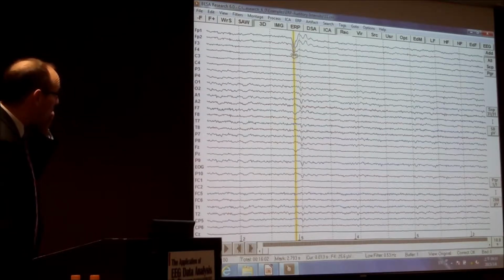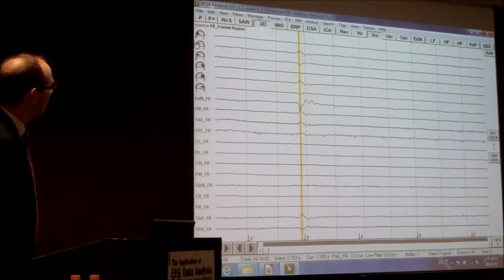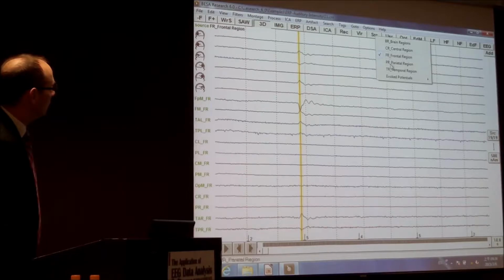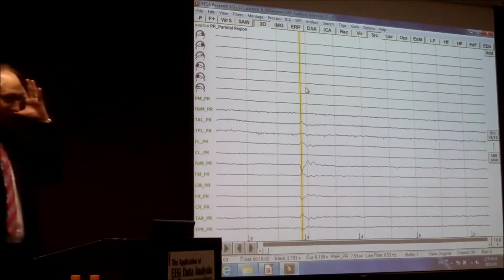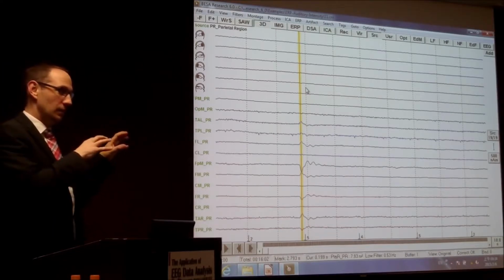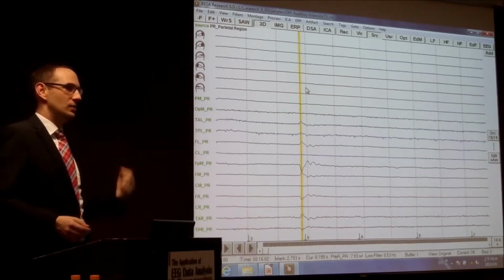And if you look now at the brain region montage, at the source montage, and look at the brain regions, let's take a frontal region, and you see that the blink is perfectly in the frontal region. See here, here, a little part here, and as well here. But if you go to the parietal region, you will see nothing of the blink. So you see very easily that these montages take the signal which is on the scalp, transform it into the brain. We have placed some dipoles and regional sources in the brain. They try to explain the signal and say there's the center of gravity.